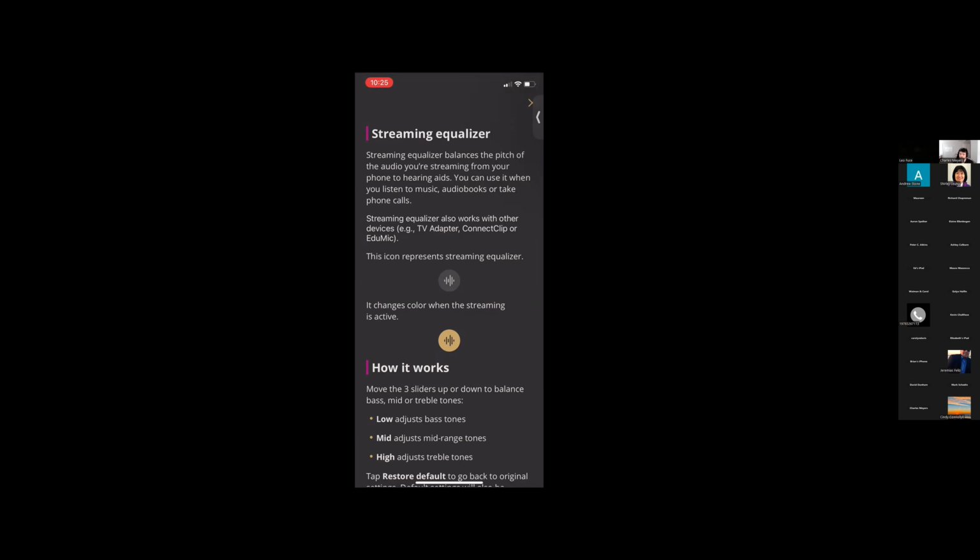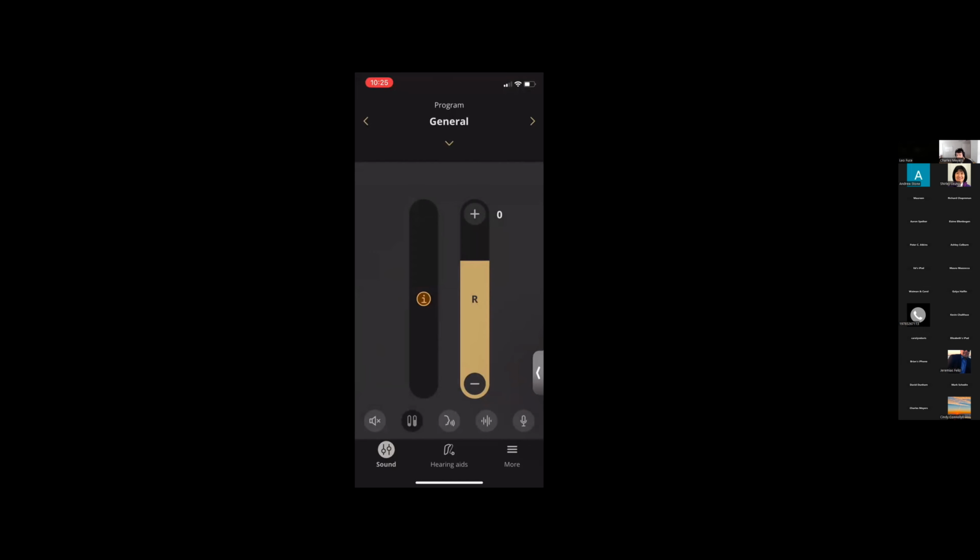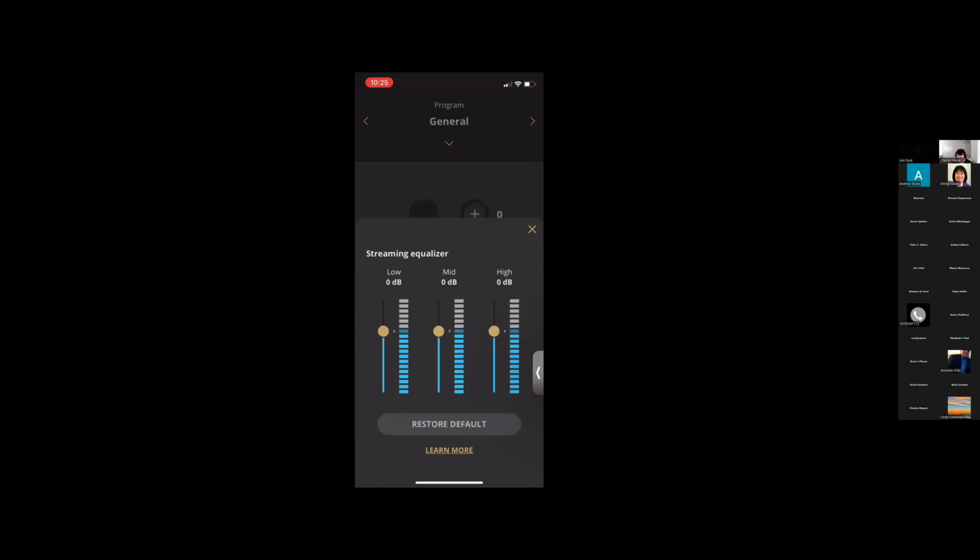So for me, struggling with the treble tones, the high tones, I typically raise the booster for the high. So to go all the way back, when we click this fourth button, what happens is it brings up another additional menu that takes up about, I'd say, 2/3 of the screen. On this menu, there are 3 options. They are the lows, the mids, and the highs. Under each individual option, these options are shown from left to right in the middle of the screen.